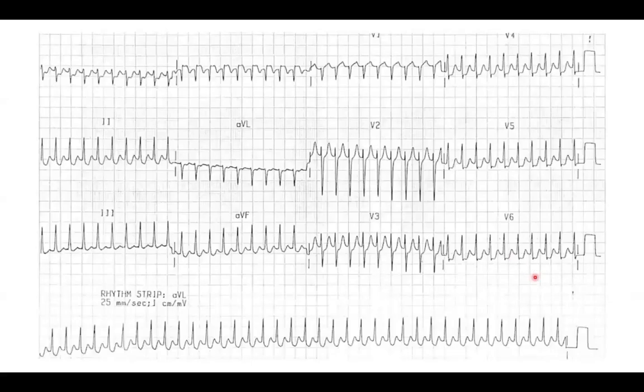All right, so here is our next EKG that we'll review. So again, just take a second to pause the video and go through what you think is going on here.